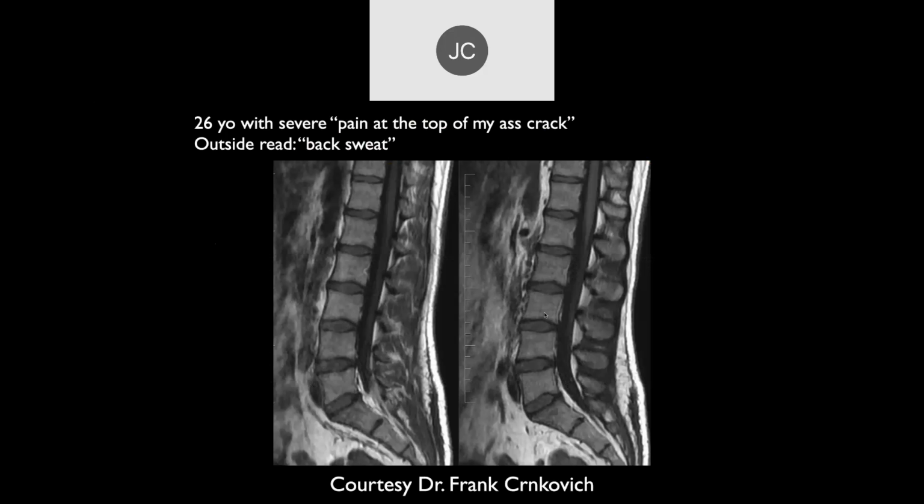Okay, 26-year-old with severe pain at the top of the gluteal cleft. Here's T1, and is it with contrast on the right, maybe?